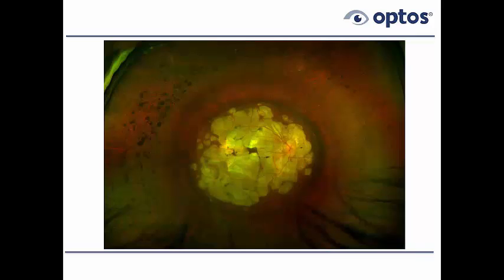In some cases like fundus albipunctatus, which we mentioned, we showed you one case of that, I haven't seen any cases of fundus albi where the spots actually have become black. So it's interesting. They're bright because there's some type of abnormality, a sort of sick RPE, but in that specific condition, it seems like it stays sick chronically and doesn't seem to progress very rapidly, just minimal progression. But most often, the light zones become dark, and sometimes it's frequent. Sometimes it can be relatively rapid within several months.